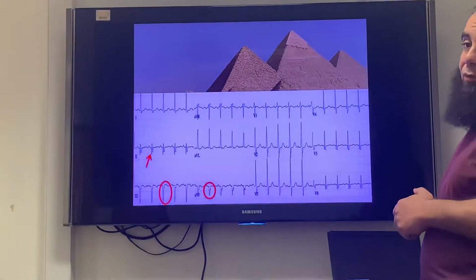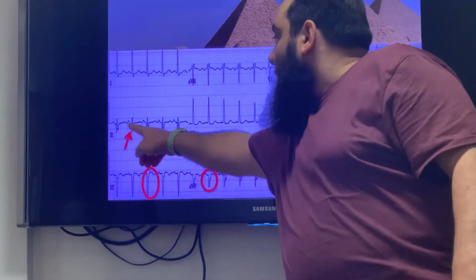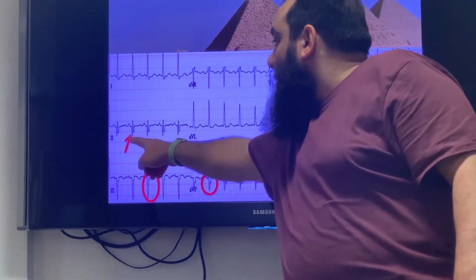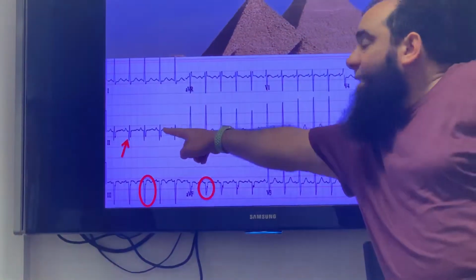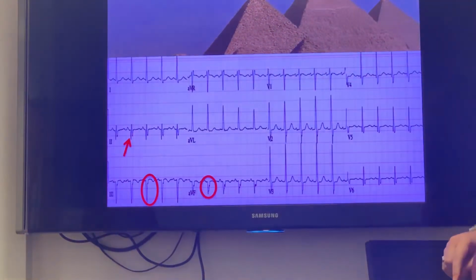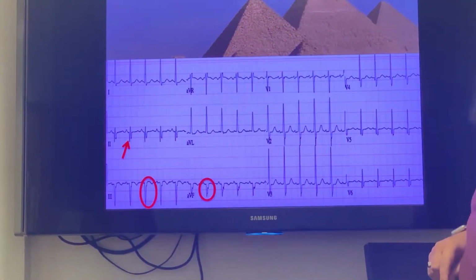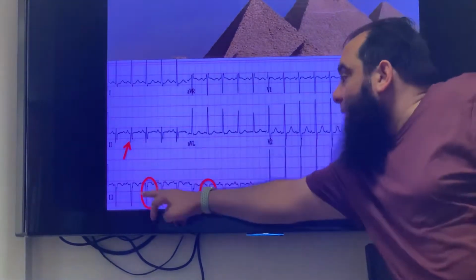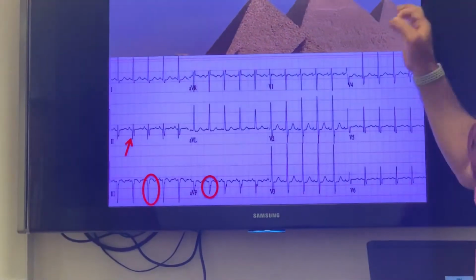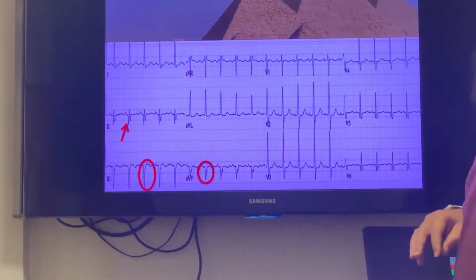Then an example of the Q wave again. If you can see here the Q wave, is that pathological? It is deep, is that right? Deep. What about the ST segment? It's flat, it's okay? So is it old or new? It's an old one. Same way in aVF, lead 3. So I can imagine that patient had an inferior MI, but he had, not he has.